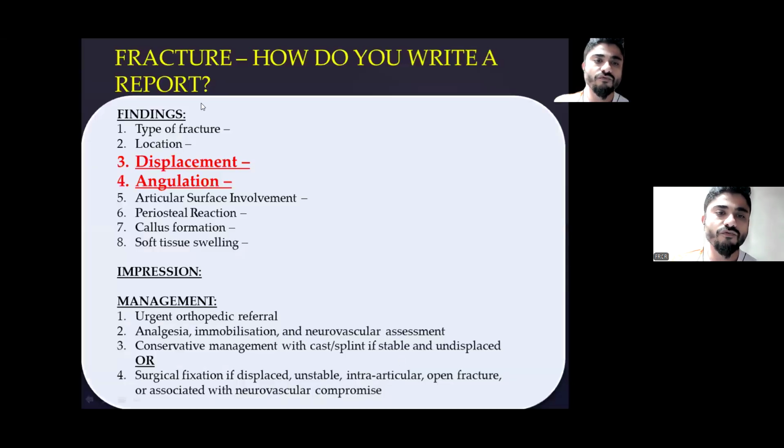Now the location is done. Now we'll move on to displacement and angulation.